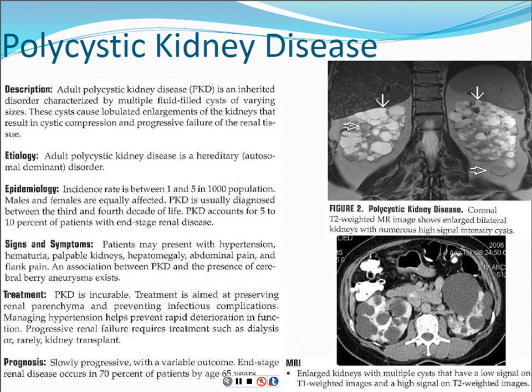These are the kind of kidneys where, if the patient's able to take contrast, you want to try to do a contrast-enhanced study. Frequently, however, because their kidneys are being replaced by cysts, these patients can't tolerate contrast administration for either CT or MRI, and many of them will eventually need to go on dialysis or have a renal transplant.